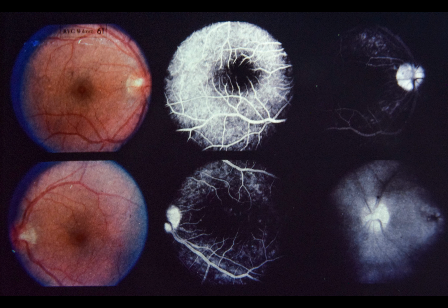Upper center, parafoveal capillaries in the right eye appear normal during early dye transit. Upper right notes subtle but definite leakage from parafoveal capillaries 5 minutes after injection. Lower center, there is parafoveal capillary leakage in left eye 1 minute after injection. Lower right notes cystoid macular edema and late leakage on the optic disc 30 minutes after injection. Since visual acuity was 20/15, we recommended that steroids be discontinued despite the presence of cystoid maculopathy.